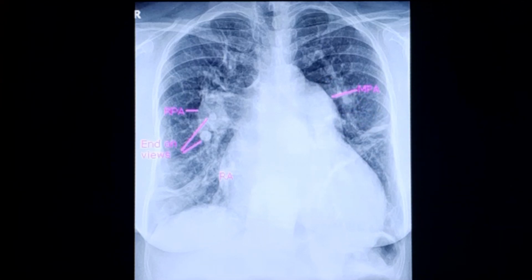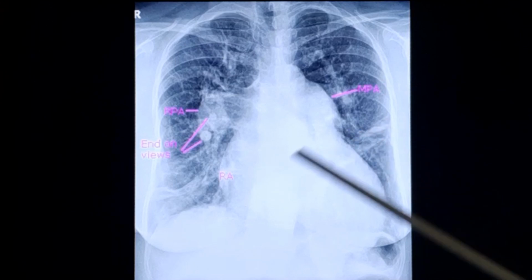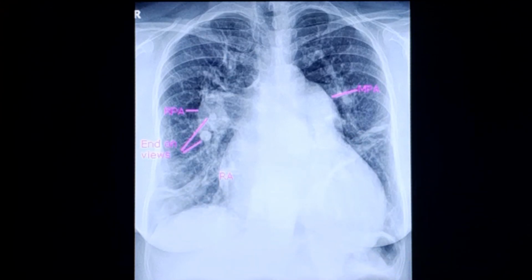That would indicate that the cause of pulmonary arterial hypertension was probably a previous left to right shunt. Then there are some fibrotic strands here also. These do not appear to be typical vascular markings, and they are most probably sequelae of previous respiratory infection, which are common in those with left-right shunt. But frequent respiratory infection in infancy is more of a feature of post-tricuspid shunts like VSD and PDA rather than atrial septal defect.